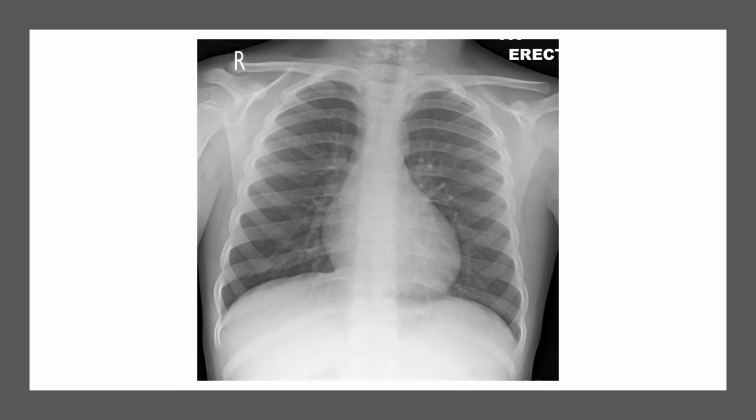Pediatric x-ray. This is a pediatric x-ray. Still you see a cardiac silhouette that's somewhat larger in space compared to an adult ratio. So you'll see some of those minute differences. Obviously you see that the bone structures are closer to each other than what we were looking at previously. Collarbones are symmetrical here.